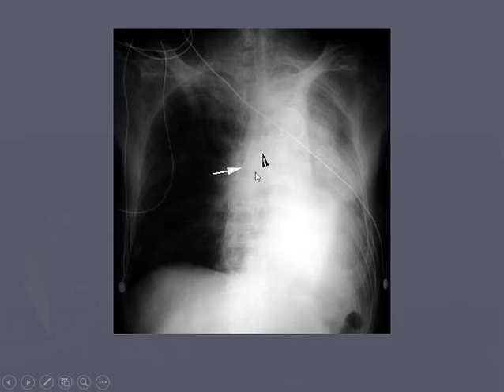As I mentioned before in my atelectasis section, what happens with atelectasis is that those lungs aren't inflated. So his entire left side became atelectatic. It all squished down and pushed everything up. You can see his diaphragm's here; it should be down here.